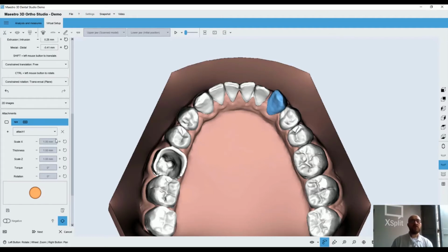It's possible to work with different layers, which means that you can define, move and rotate some groups of teeth by pressing Ctrl and double click on the left mouse button. You can select more elements and your design will affect all the selected elements.